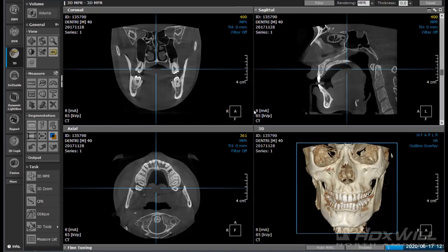Our last lecture, we talked about using our CBCT for endodontics. And so going through that, we mostly stayed within the realm of our 3D module, which is over here. Our 3D module is usually what we term our diagnostic module, and it's where we can go through and examine the bone, examine the structures of the bone and features associated with it.